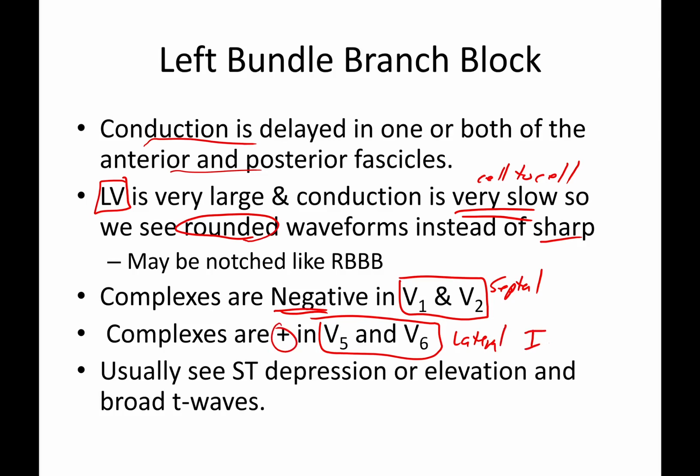It's not uncommon to also see some ST depression or elevation in these cases, simply because that left ventricle is so large and the conduction is being thrown off by so much that your repolarization has also been skewed. And as we'll talk about down the road here, ST changes are related to conduction and repolarization. So it's not crazy to see this.